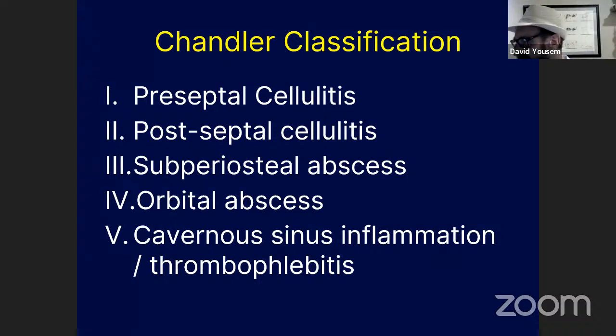So I'm just going to refer to the question here. In your practice, do you proceed to MR with contrast for cases of suspected inverted papilloma on unenhanced CT or inject contrast on CT? We're going with MRI, mainly because there is that potential for perineural spread of tumor back through the pterygopalatine fossa, as well as intracranial spread. And both of those are much better seen on post-GAD MR than with CT.